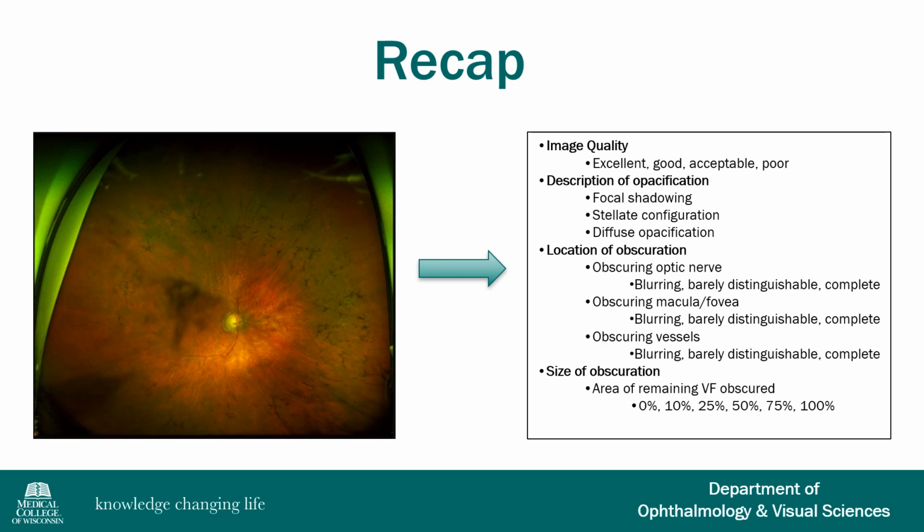To recap, we have brought to light our observations in RP patients regarding the correlation between these incidental obscurations on Optos images with the clinical descriptions of PSC cataracts. We demonstrated a systematic approach to the analysis of these images, as well as how to incorporate the limited visual field of the patient. Lastly, we stressed the importance of considering all of these factors when analyzing secondary causes of vision loss, especially when they are treatable.